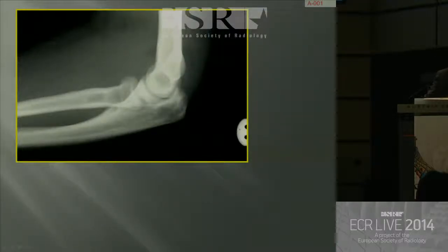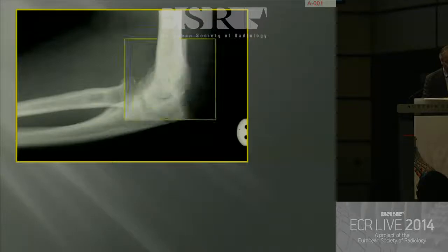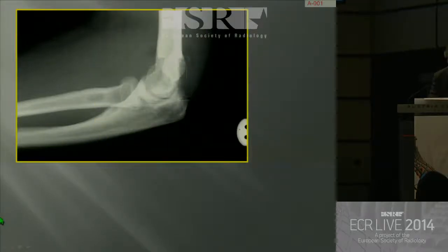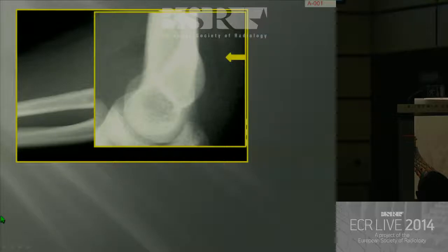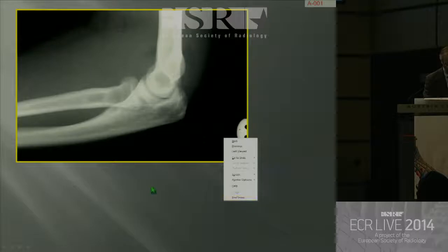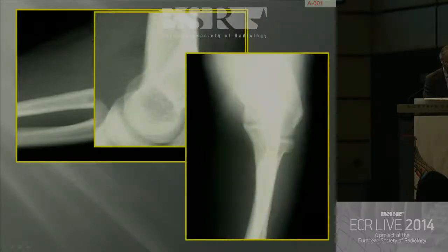Another well-known feature to look for is the soft tissues and, of course, the fat pads. Now, I'm afraid this doesn't perhaps show terribly well, but with the enlarged view, you can see there is a fat pad extending. There's also a big fat pad anteriorly, and this confirms what you might have seen in the plain film, that the radial head looks abnormal. That will tell you that there is a fracture. And there you can see again on the AP view the compressed radial head.